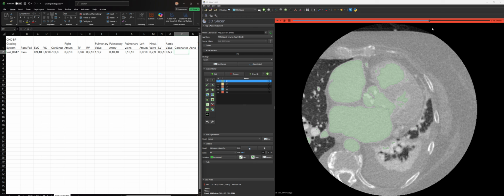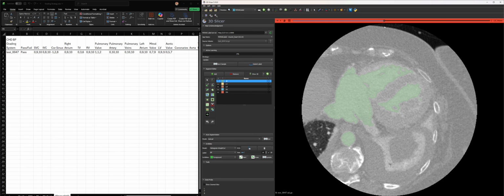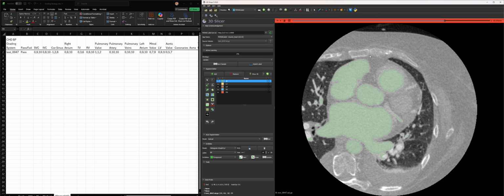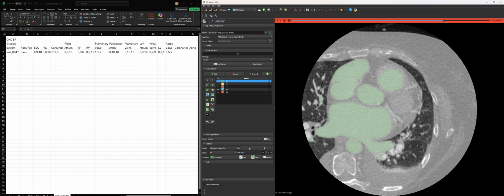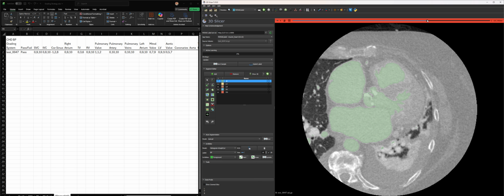Coronaries. All right. Coronary arteries here. So the right comes off to go anterior, and then the left comes off back here. So let's look at the right first. I'm going to trace that up, and it's decent. I think it could have done better.